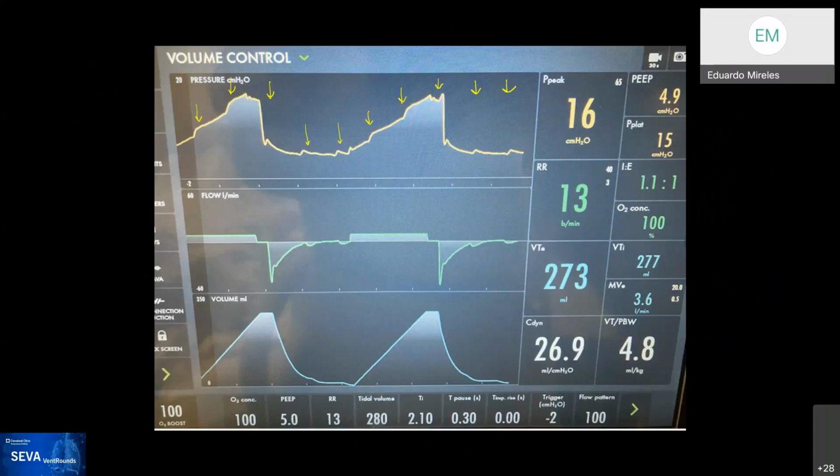And I saw a comment come in that if you have the EKG, you could have a diagnosis. Yeah, absolutely. It has to be on your mind that these oscillations are cardiac, and then you look at the heart rate and try to mark them out. The other thing that we sometimes do, and it's useful for me, is to do an end expiratory pause and look at the end tidal CO2. You will see it oscillate through time as it's moving CO2 through the sensor, which will tell you that those are cardiac oscillations, and you will see how they march with your waveforms. That's a good idea. That's awesome. I never thought of doing that. Thank you, Tim.